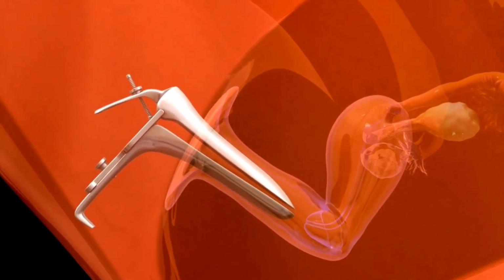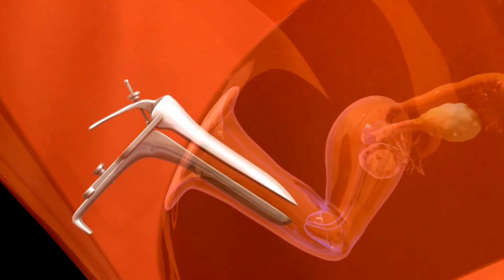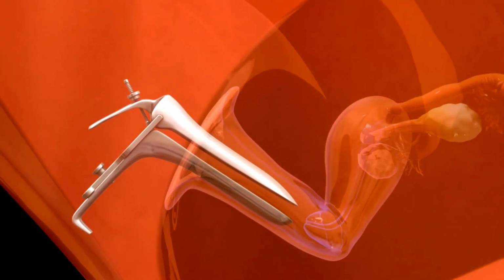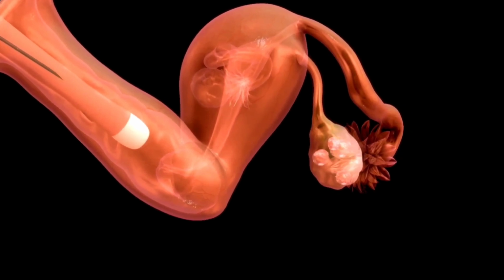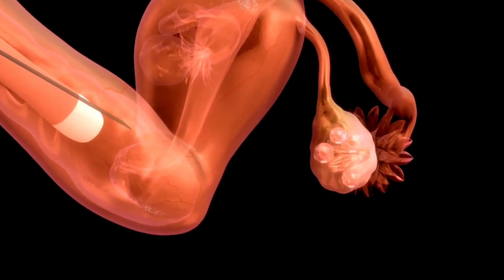In vitro fertilization, or IVF in particular, is an assisted procreation technique which consists of carrying out fertilization, that is to say a meeting of the sperm and the egg, in the laboratory, outside the woman's body, and re-implantation of the embryo into the uterus of the future mother.